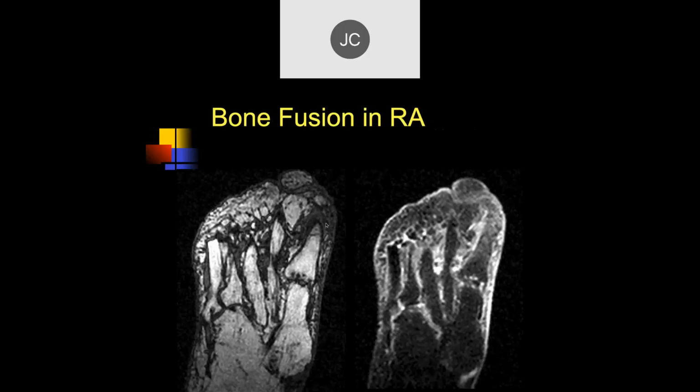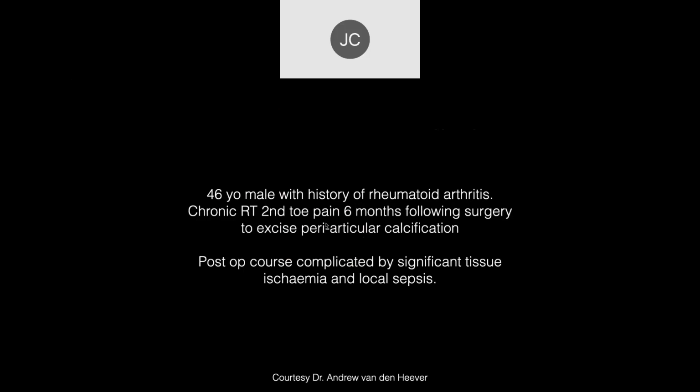And again, hopefully these kind of chronic changes you guys won't be seeing because these patients will be treated much earlier in the course of their disease. Robert.